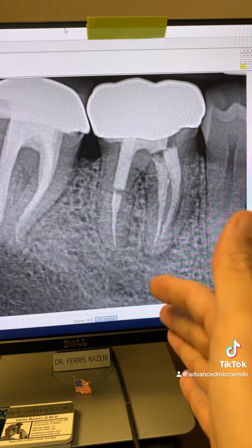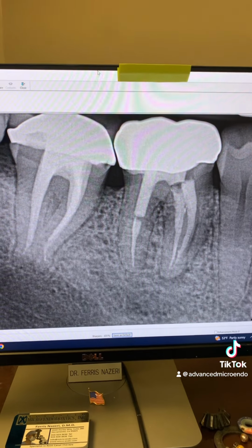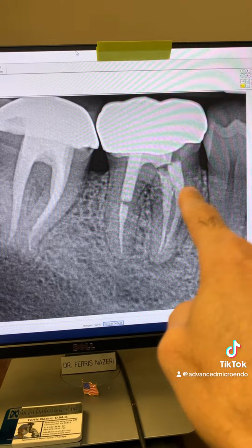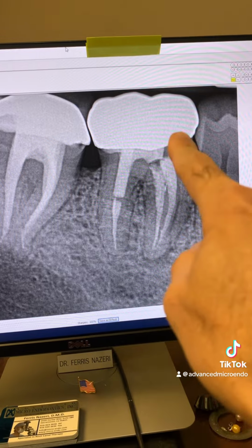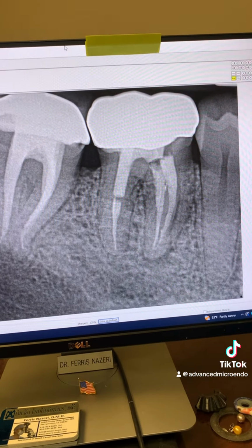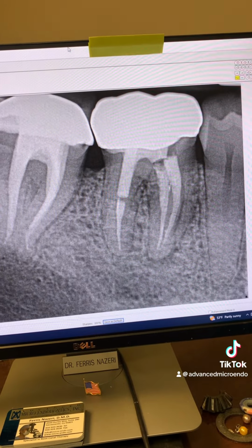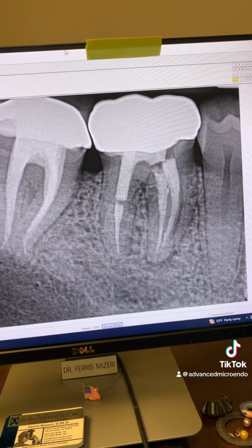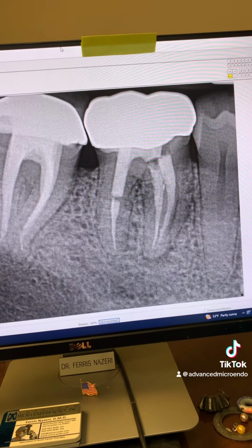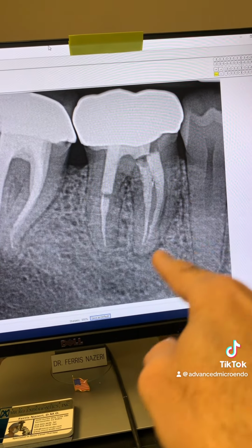Never, ever rely on just one angulation PA. In this PA, you can see the Coke bottle shaping of the mesial canals there. So that tells me that this dentist very likely used Gates-Glidden drills. So they really thinned out the canals here, the root.